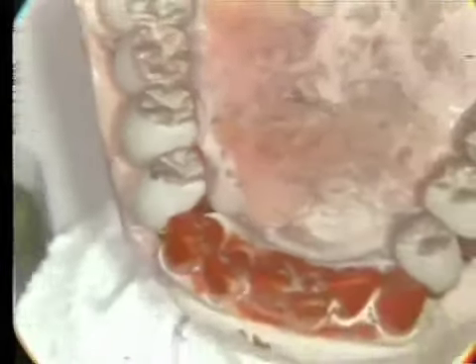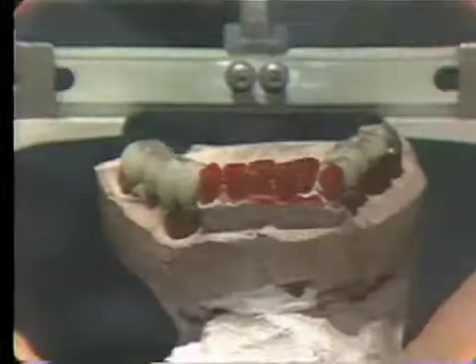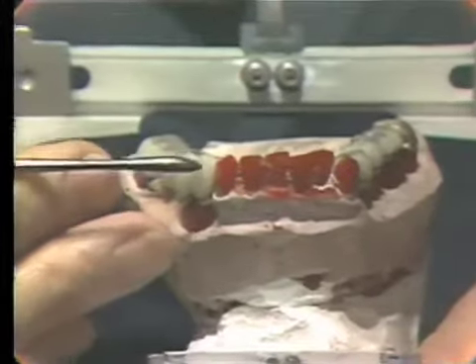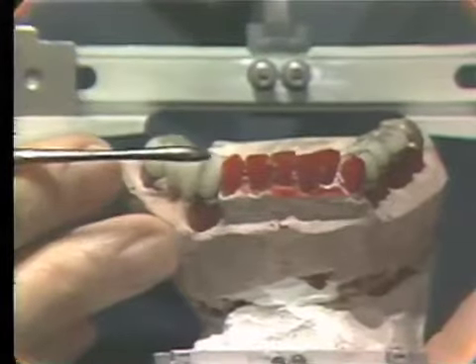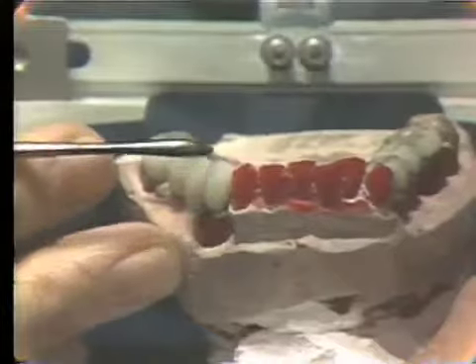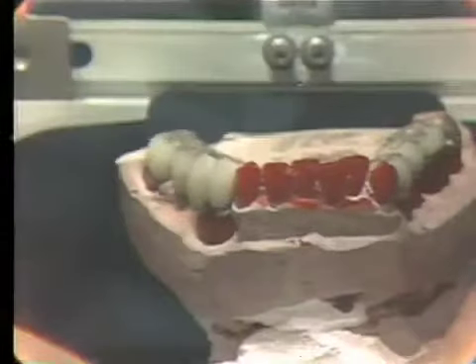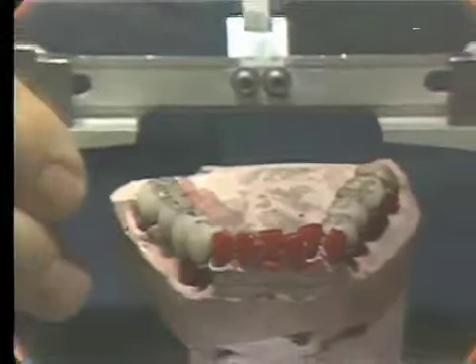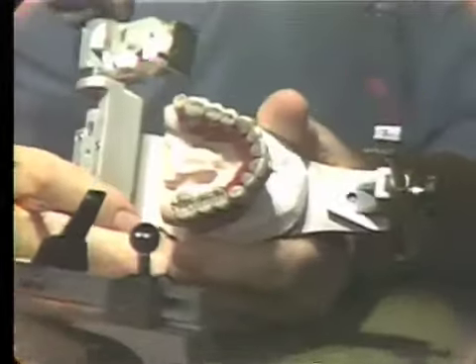So that as we look from an anterior view, the porcelain hides the gold in this area, and yet we have the gold for our occlusal contact, so that there isn't so much gold showing on those bicuspids. We have changed the porcelain in the maxillary crowns to camouflage the gold a little bit too.